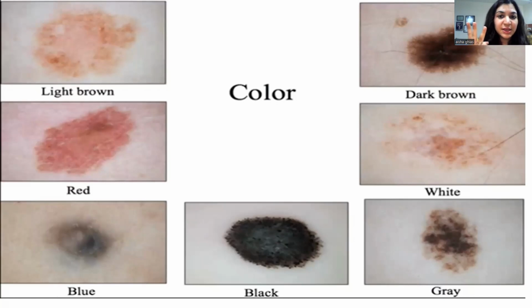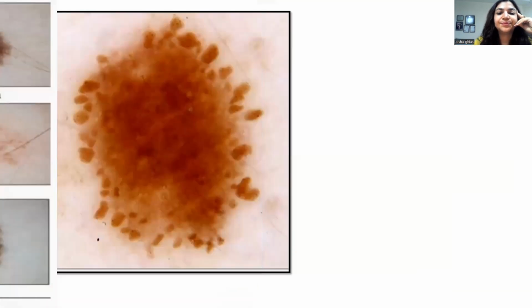See these 3 things in all the melanocytic nevi, and then right at the bottom of the nevus, what exactly it is. Is it a dark brown, uniformly pigmented reticular nevus, or is it eccentrically hypopigmented pinkish globular nevus, things like that. Then you go on and on. So you basically consider three things in melanocytic nevi. These are the morphology, pigment distribution, and the color.